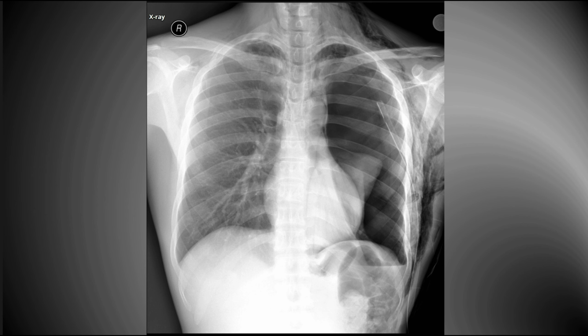In this situation, the patient has a pneumothorax. A chest tube has been placed. You can see the tip of the tube, but you will also note that the pneumothorax has failed to resolve. The reason for this is the second eye is outside the pleura and air is escaping from the lung into the subcutaneous space, so the patient has a huge amount of subcutaneous emphysema. The tube needs to be reinserted correctly and perhaps placed on some negative pressure.